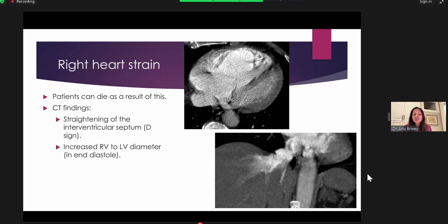The other situation in which pulmonary arteries can often be enlarged is if you have a shunt. So it doesn't mean that they have to have pulmonary hypertension, like that the pulmonary hypertension is the primary issue. They might have a shunt that needs to be fixed. So pulmonary hypertension is, I guess, to answer the question, a separate diagnosis. And so whether or not their right heart is enlarged in that situation, I guess it's kind of superfluous, right?